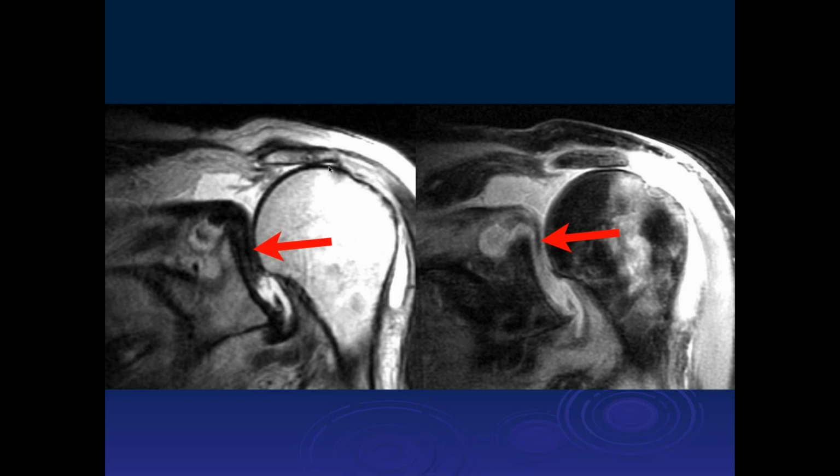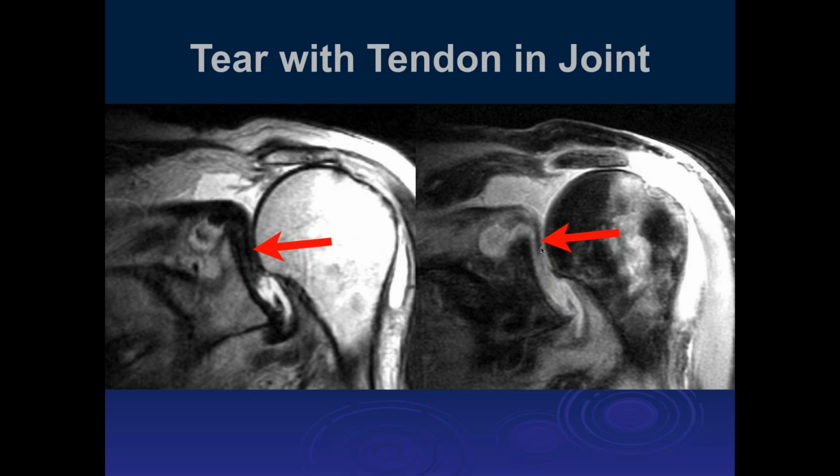Okay, so there's a hypointensity there. Now I think that's one of the tendons, probably the supraspinatus tendon, that's displaced into the joint. So that's the other thing you need to look for: when tendons get into spaces where they're not supposed to be, that can be a problem. We'll talk about a lot of other areas in the musculoskeletal system, like the fingers and elsewhere, where displacement of tendons and ligaments can lead to symptoms or abnormal healing, and may be an indication for surgery.